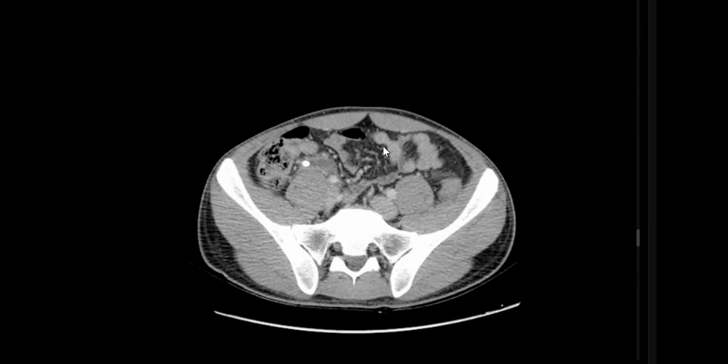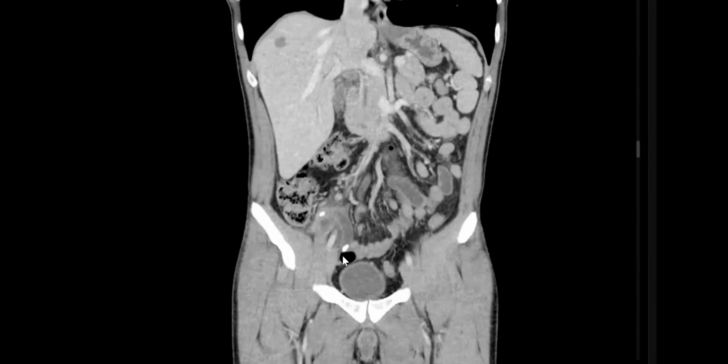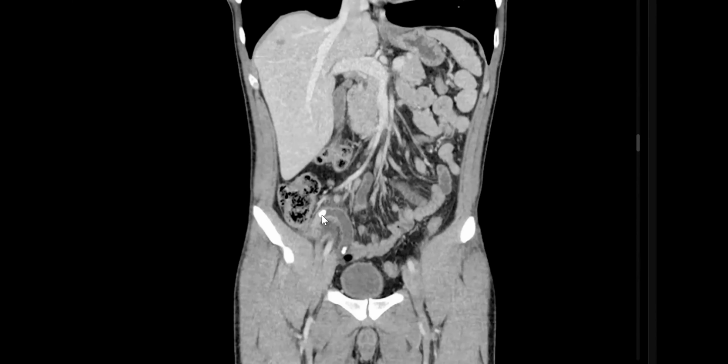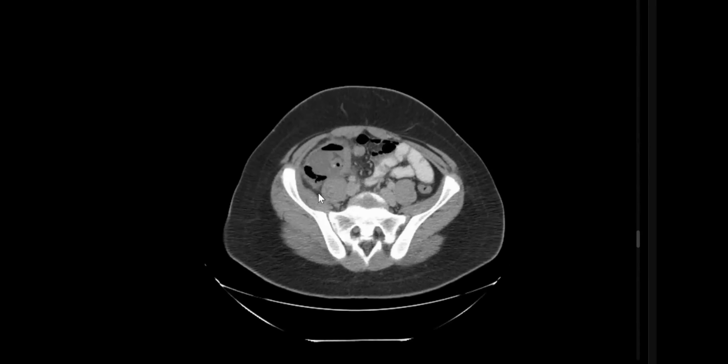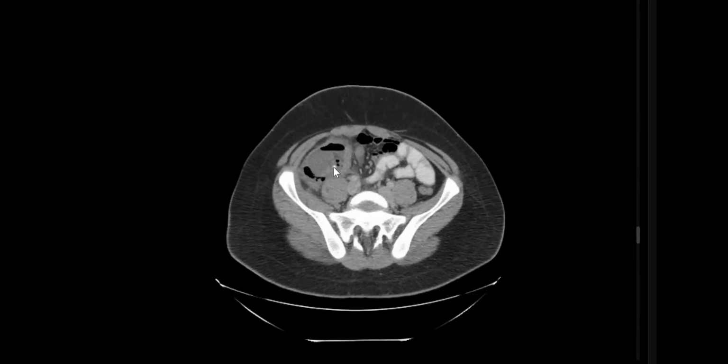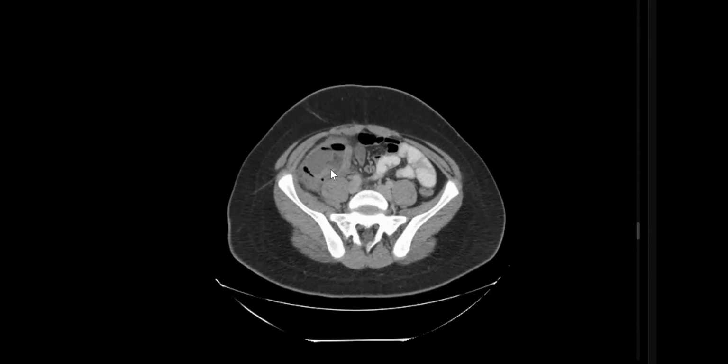If a tubular structure with an appendicolith-like structure arises from the small bowel, it will be Meckel's diverticulum. What if a similar tubular structure arises from the left side and I cannot see the cecum in its usual place? It would be non-rotation with appendicitis. Very good. It will be a non-rotation or malrotation. The appendicolith is a clue. Regarding your case, I have a collection, an enhancing wall collection with air fluid inside. The presence of a hyperdense structure is the clue. Even in the right iliac fossa or the subhepatic location, this means appendicolith. So it's an appendiceal abscess.